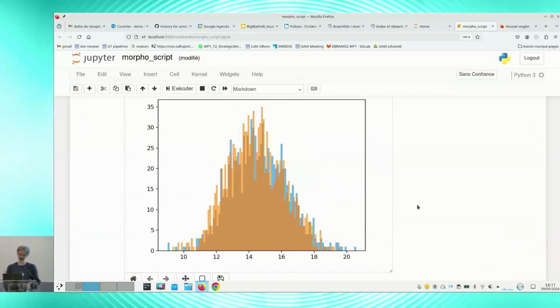And here it's not corrected for the global size effect. So when you perform a study, you have to be careful of this kind of effect, and you have to select if it's appropriate to use normalized or native space measurements.